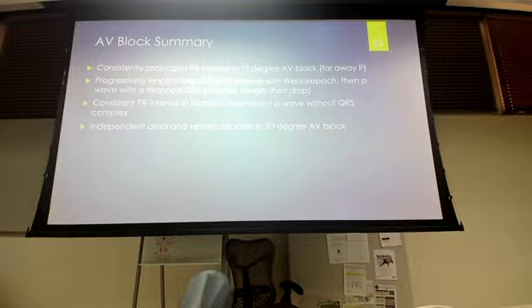Hopefully. So the block summary: we got a Wenckebach, longer drop. We've got our Mobitz 2. Notice too, the PR interval is going to be normal, but we just got spontaneous drops of our QRS complex.